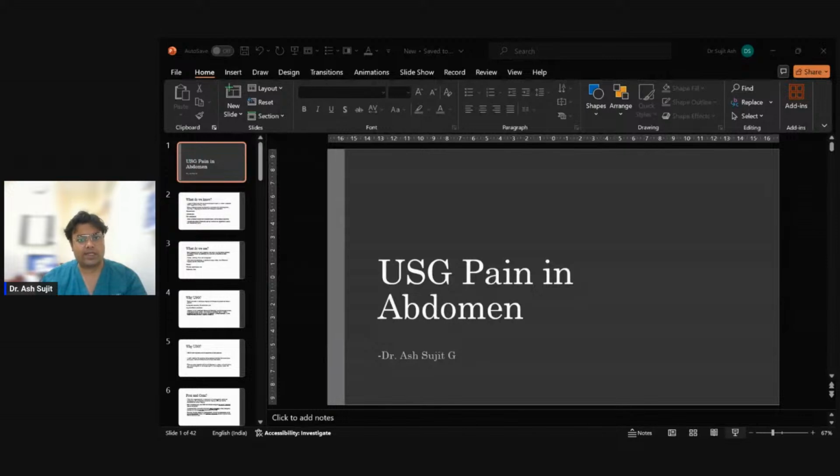So, depending upon all these things, you can think about the ovarian torsion, how much the size of the ovary will be, and whether you can save the ovary. The edema happens because when the ovarian twisting first happens, the lymphovascular pedicle is occluded, the lymphatic and venous channels are occluded, and this will lead to engorgement of blood in the ovarian parenchyma and subsequent edema. As it progresses, the arterial blood supply is compromised.